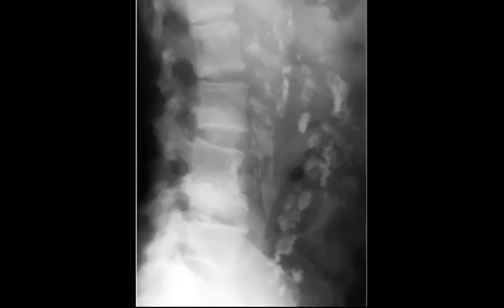With the calcified psoas abscesses or the calcified paraspinal psoas lesions, maybe you can think about TB, tuberculosis. Nice. So this is what is called Pott's disease or TB. So calcifications, this is the title.